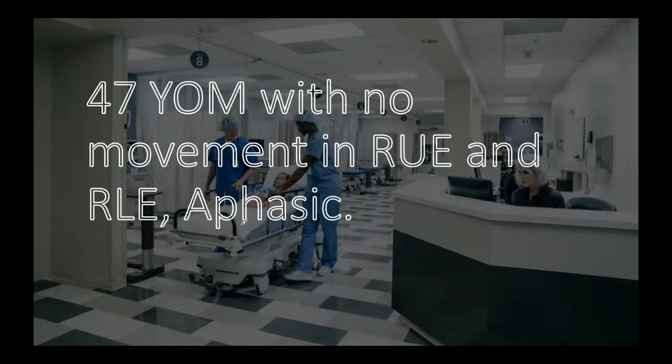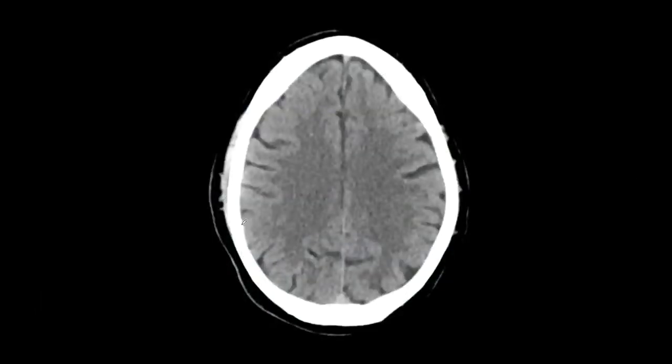The next patient is a 47-year-old male with no movement in the right upper extremity and right lower extremity, and the patient is aphasic. By the way, I picked all of these studies from our hospital, so many of you could have seen many of these patients. They are all real patients. So this is the first image that we got, and it looks like a normal CT head. I will give it to you.